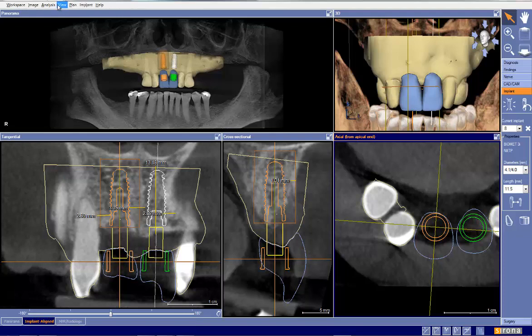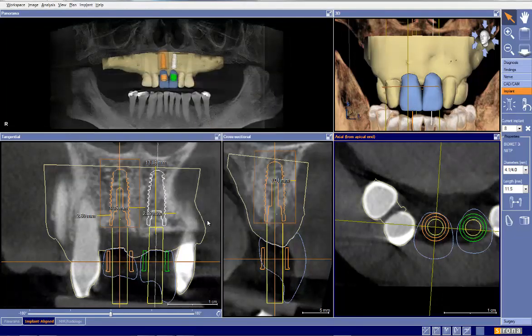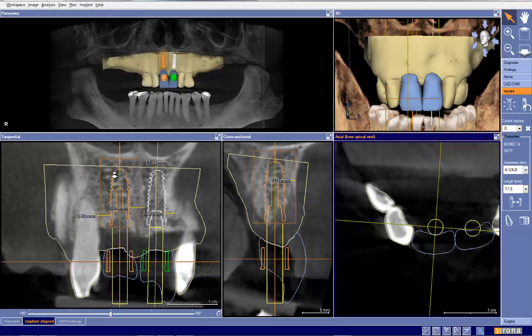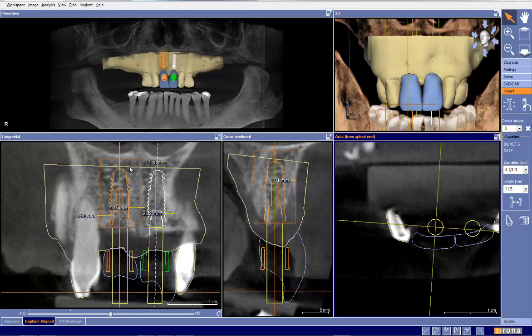Okay, so we do not need to worry about the tie base getting into occlusion there. So other than that, I'm pretty pleased with this design right here. My bigger question is going to be, is this tooth wider than this tooth? But that's splitting hairs a little bit here.